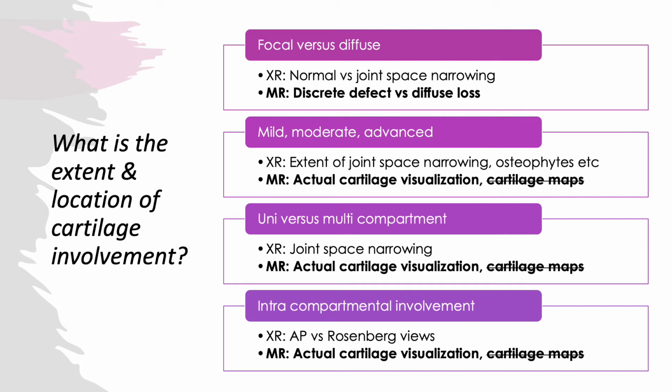We can also determine an area of intra-compartmental involvement. Is the compartment involved more anteriorly or more posteriorly? Is it involved more medially or laterally? All through this similar process. And MRI again can demonstrate these things, even though we have tools to look at this with radiographs.